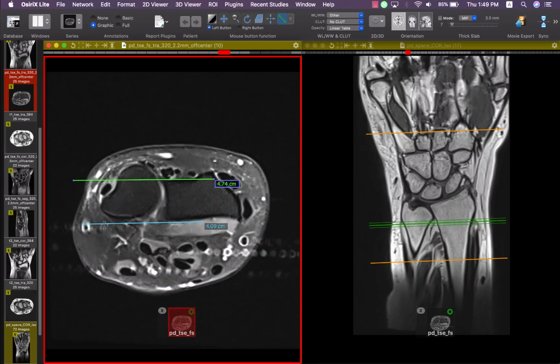But it is important to say that you should comment upon the distal radioulnar joint by this mechanism, or by these relations, only if the wrist is imaged in a prone position. You should image the wrist in a prone position to say this is dislocated or subluxated, or follow this rule, in just a pronated wrist.